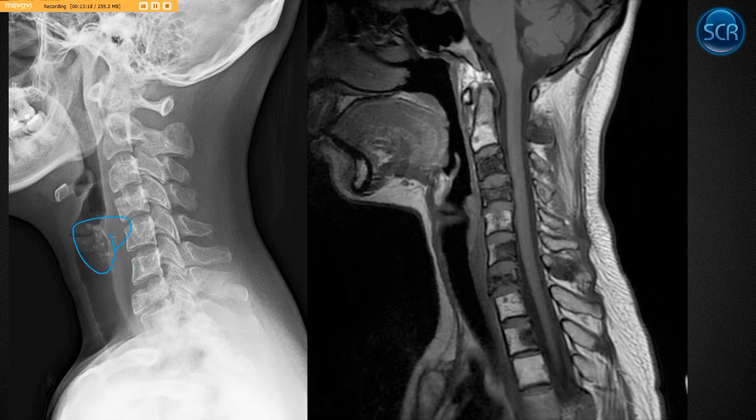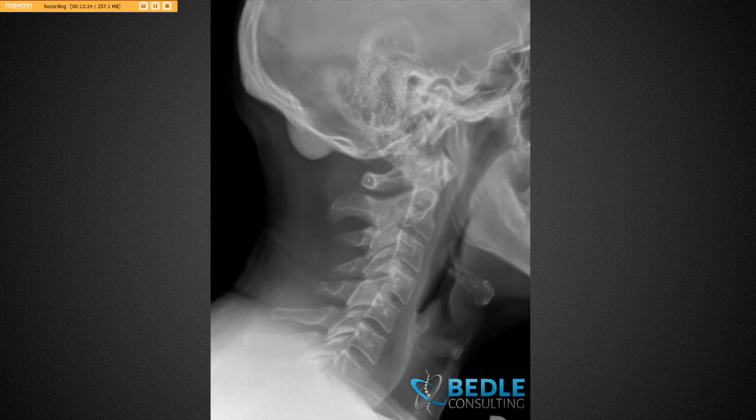Okay, thyroid calcification normal. Don't call that abnormal. The only findings here are in the spine. Here's another example from Dr. Beadle of a neoplasm. This one's benign, completely homogeneously dense, rising from the skull. Just looks like someone took a little ice cream scoop and scooped on some vanilla ice cream back here. This is an osteoma, all right? No big deal. The only time these are a big deal is if they compress something that you don't want compressed.